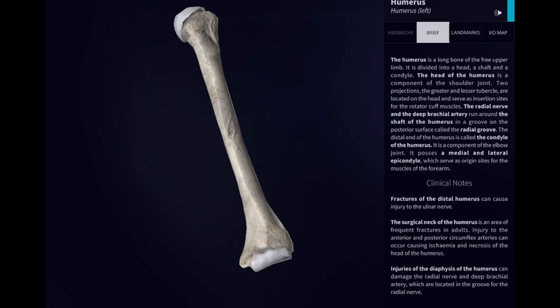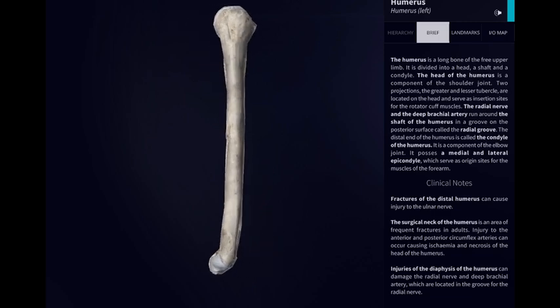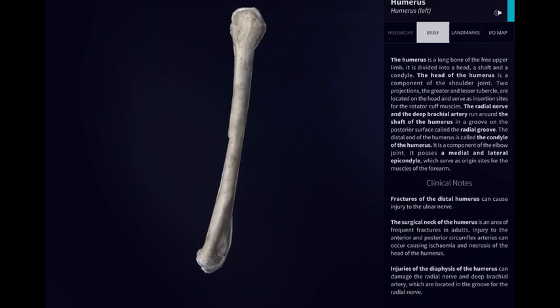But then when the humerus is internally rotated like this, you're not going to be able to see the greater tubercle of the humerus, giving the humerus this rounded, smooth contour, which is described by the radiologists as a light bulb appearance.